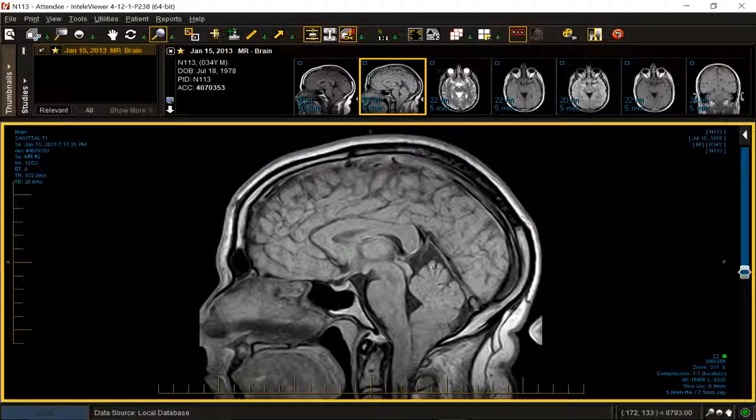So let's go directly to the area of interest, the craniocervical junction. The findings are obvious. It's a Chiari malformation. What type of Chiari malformation? I don't need you to answer. I want you to decide internally on your own. And the answer is Chiari 1.